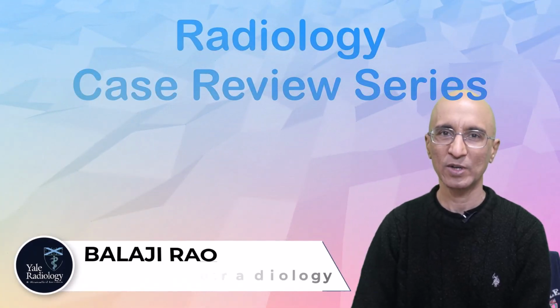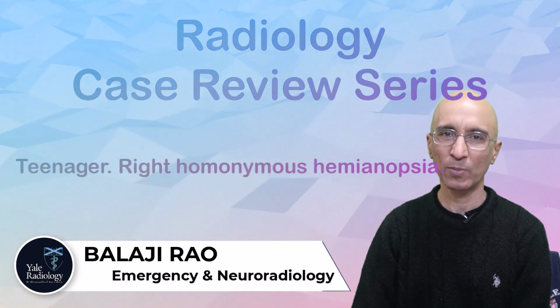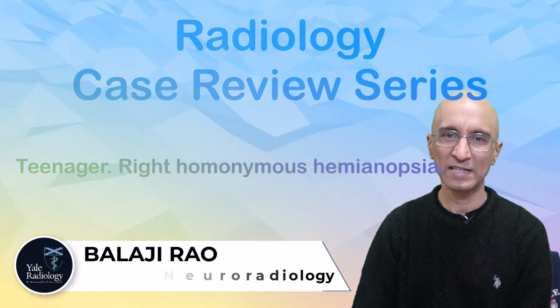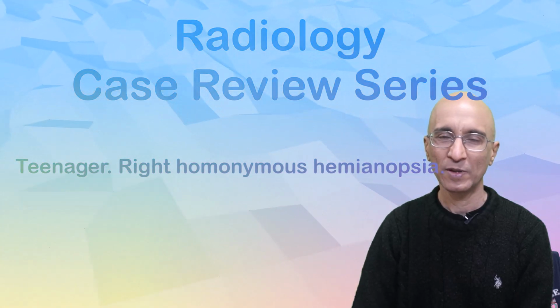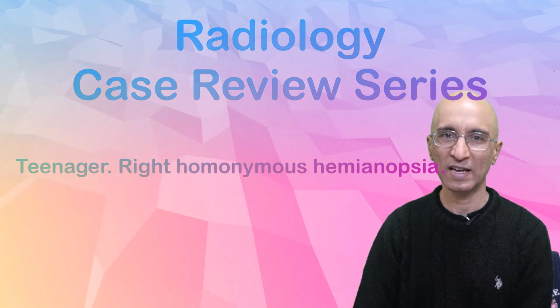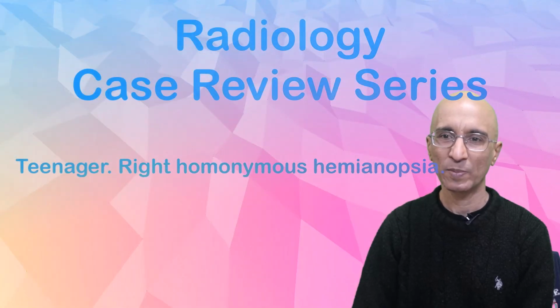In this video, we are going to look at images of a teenager who was referred to the emergency department by an optometrist. The optometrist noticed the patient had mild papilledema. Upon evaluation by an ophthalmologist in the emergency department, they noticed that the patient has right homonymous hemianopsia. The patient was referred for an MRI orbits examination.